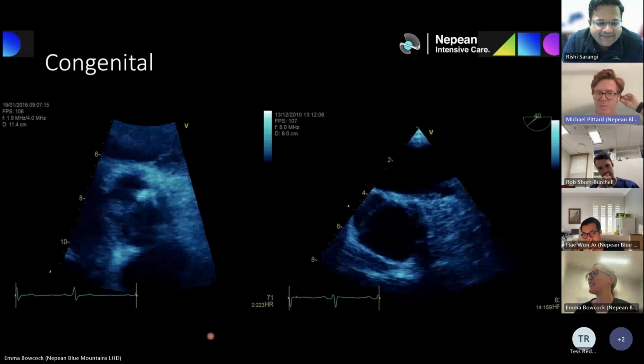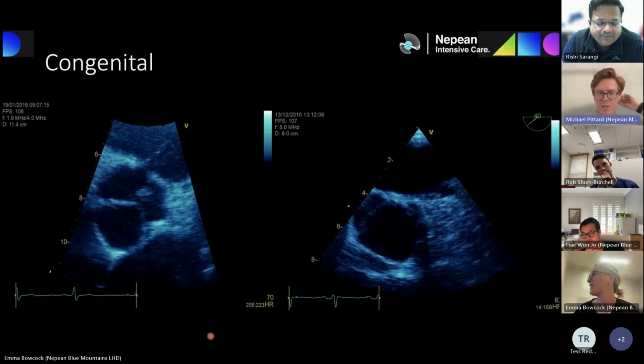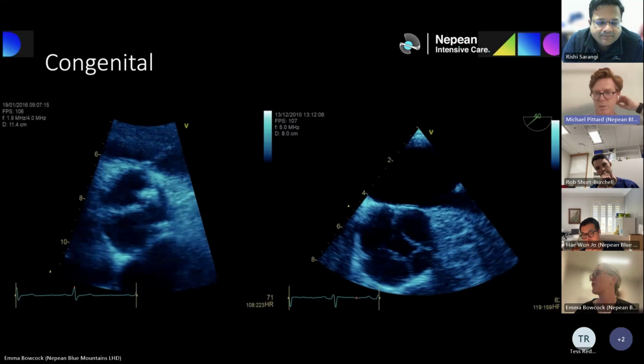It looks like a bicuspid valve with fusion of the left and the right coronary leaflets. I think it's a transthoracic image. There's reasonable excursion of the non-coronary cusp, but those left and right are fused and maybe a bit calcified at the fusion. Maybe overall it has reduced opening compared to a normal valve.